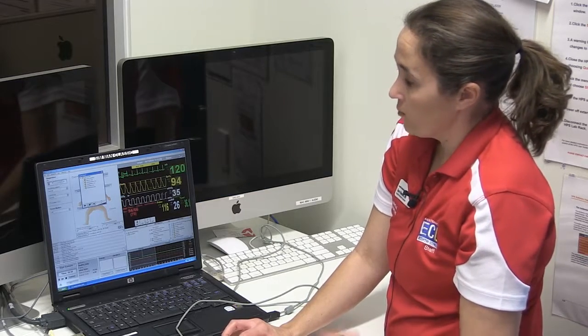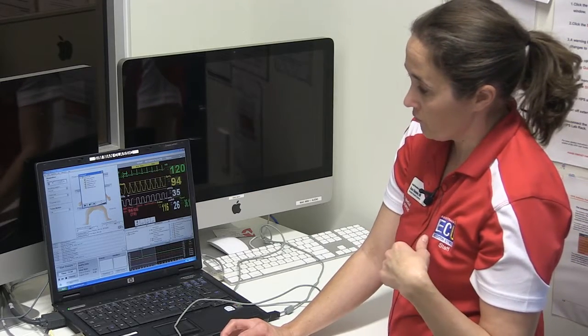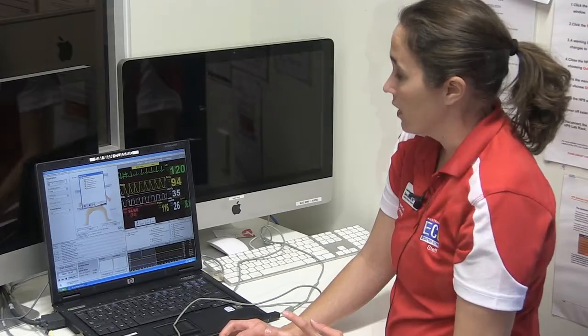You can also hit play, so it'll play once, or you can do it on a loop, so it'll just continually do that. And that's that second one, that's the play button with the loop. You can also stop it if need be. If there's an intervention that they were given and you want to stop the crying, then you can stop the crying that way.